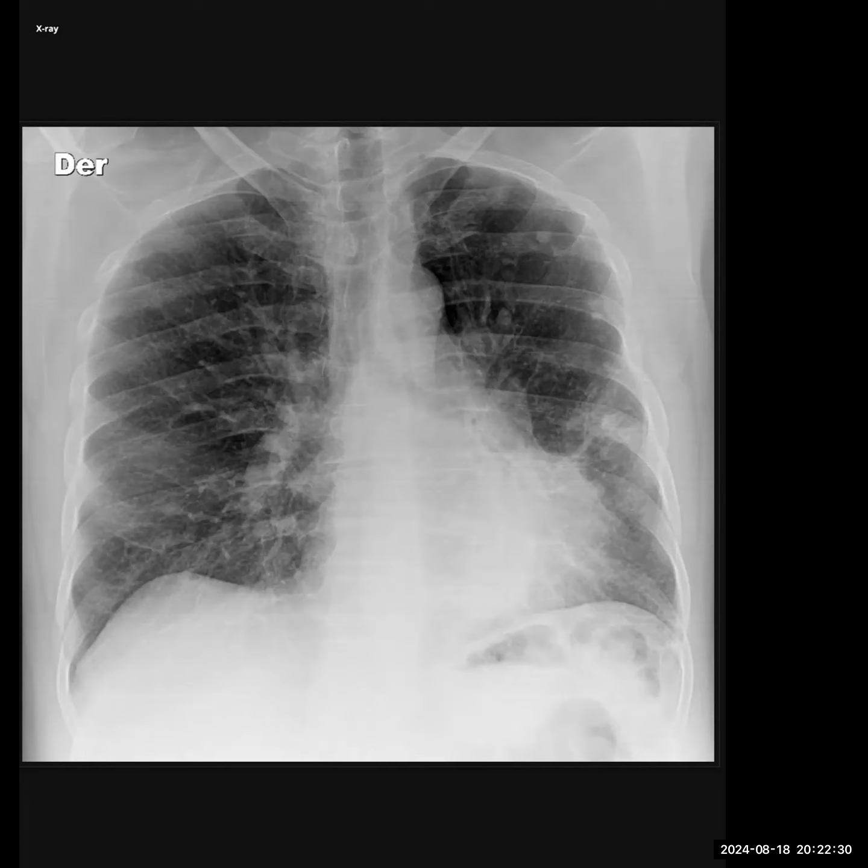I can also see significant fibrotic parenchymal bands extending from the mediastinum towards the periphery of the lung, especially in the left lower zone. Bilateral hemidiaphragms appear unremarkable. There's no obvious evidence of pleural effusion. There are no concerning findings like pneumothorax or pneumomediastinum. Quickly looking at the bones, I don't see any sinister lesions.